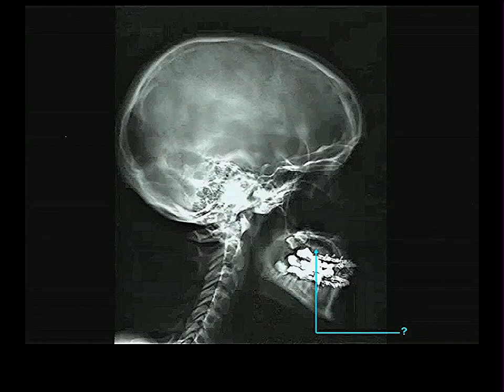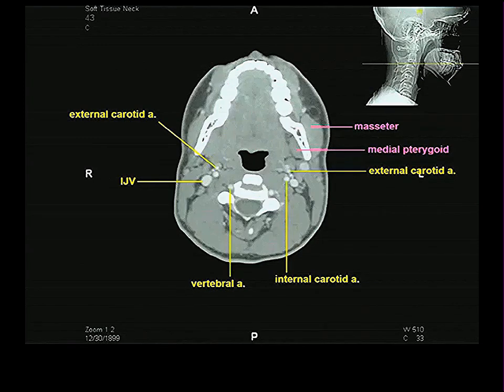It's bone with radiolucency, a big radiolucency, superior to it. Maxillary sinus? Yes, very good. That is the floor of the maxillary sinus. Maxillary sinuses can be quite big. Not that you would ever look at these things in plain film anymore. Never done. So we'll jump right immediately into CT, which is where most of the studies reside.